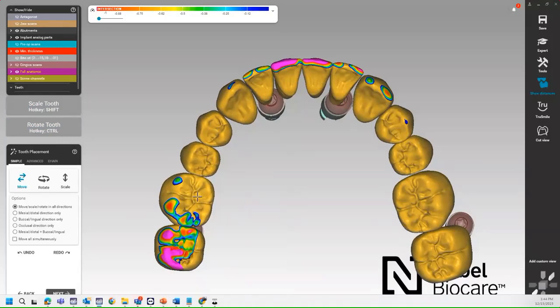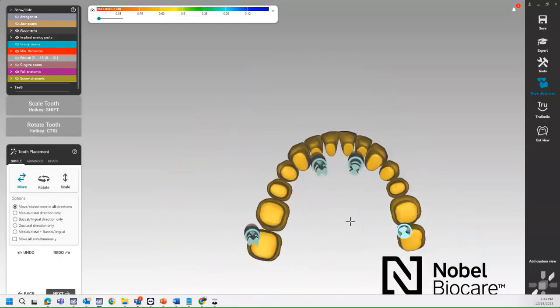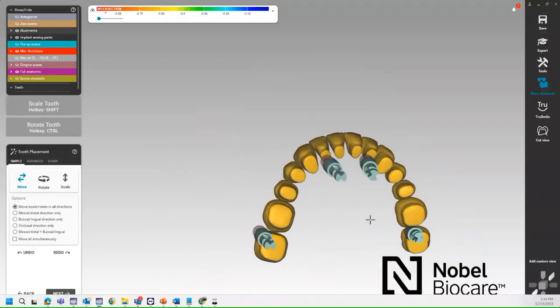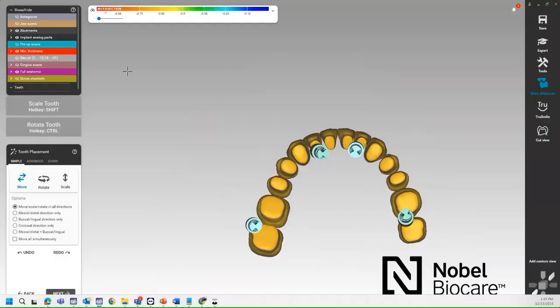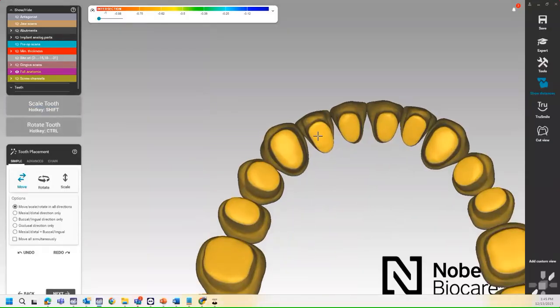And just for the sake of time today, I'm going to do this very basic. Turn off my analogs. And all right.